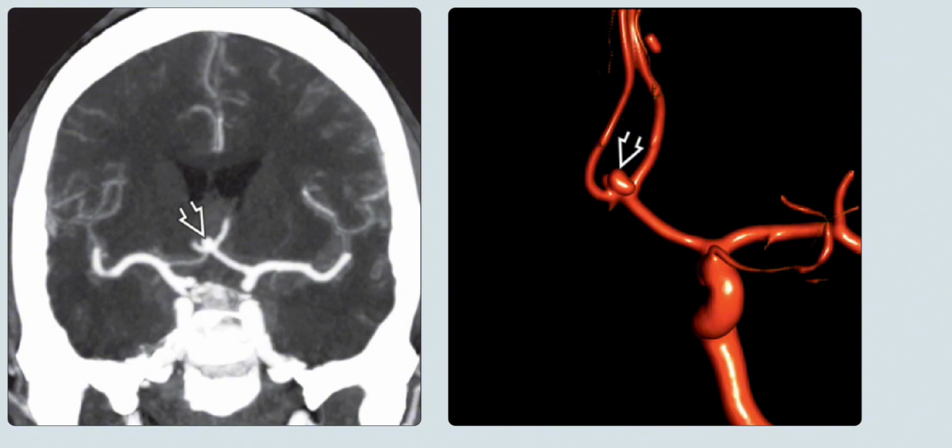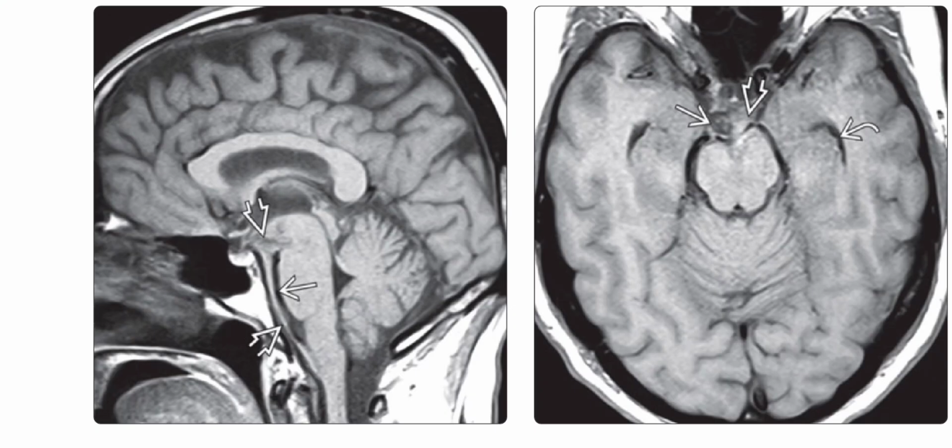Left is the coronal MIP image of the CT angiography obtained in the same patient, and it shows a saccular aneurysm projecting superiorly from the anterior communicating artery. Right image is the coronal shaded surface display of the DSA obtained in the same patient, and it nicely shows the culprit aneurysm. This lesion was successfully coiled after this diagnostic DSA was performed.